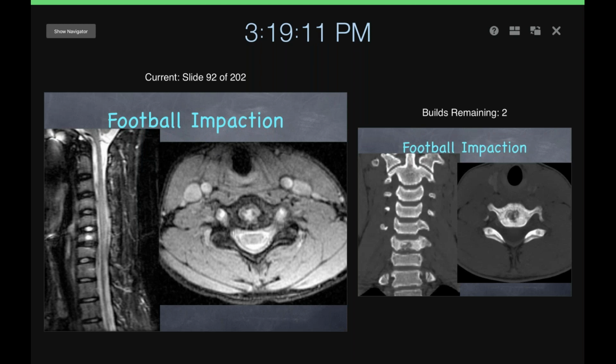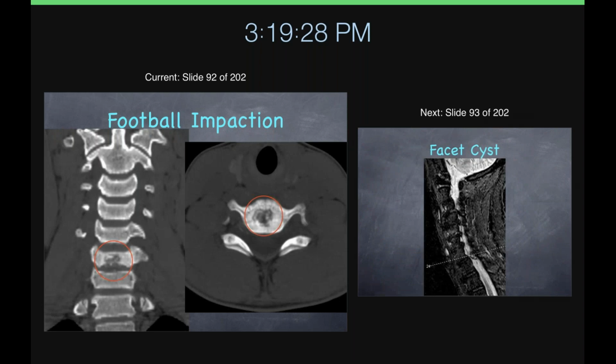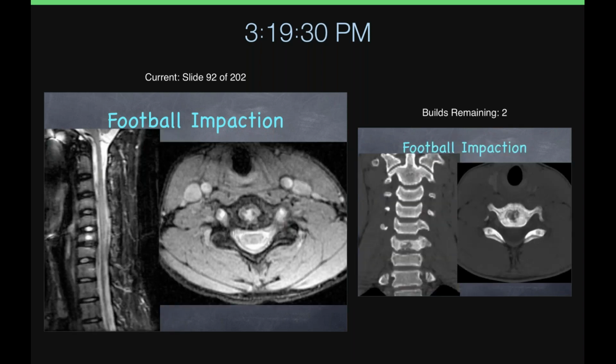Yeah, within the vertebral body, and that's what it looked like on the axial plane. Here's what it looks like on the CT. It looks more chronic. I think it's kind of chronic, and it's probably Schmorl's or a degenerative thing. The disc under it is the.